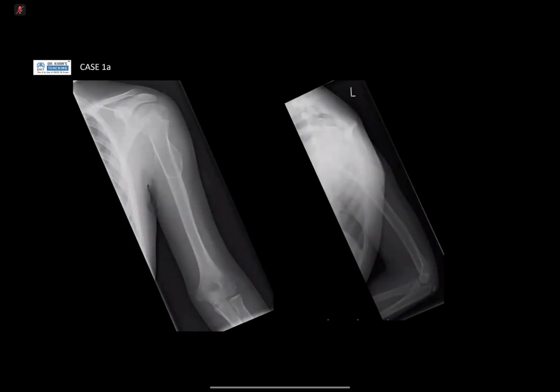Right, so if I could have candidate 1 to have a little go at describing the first case. Okay, this is a frontal radiograph of left upper limb, humerus, and the left shoulder joint. I see there is in the proximal left humerus a lucent bony lesion with well-defined sclerotic margin.